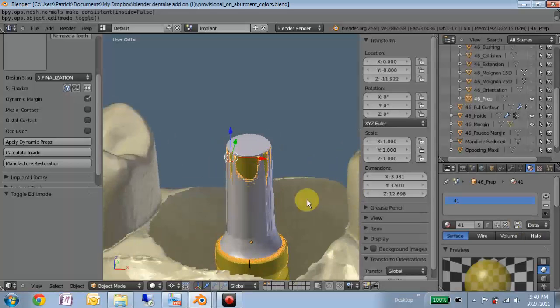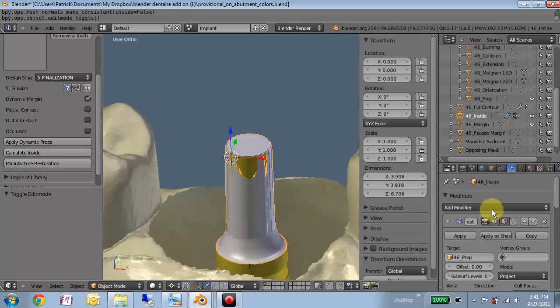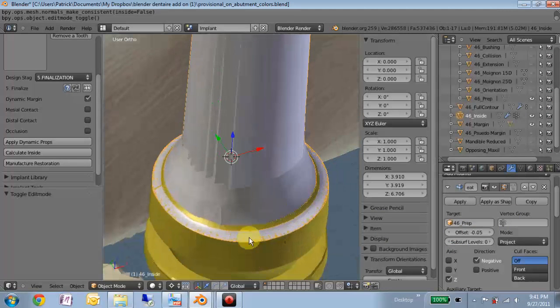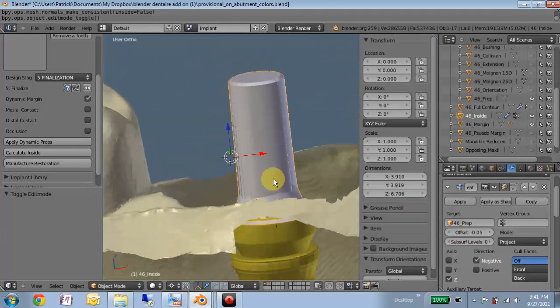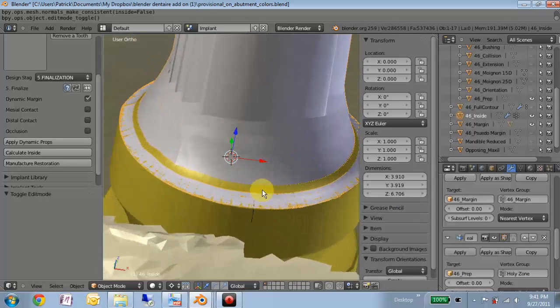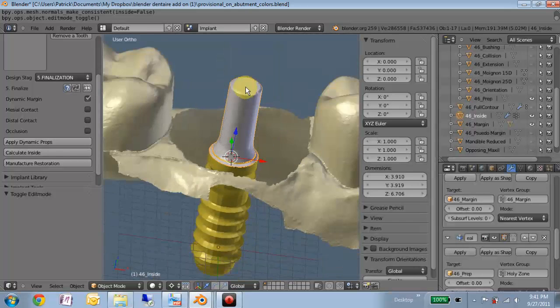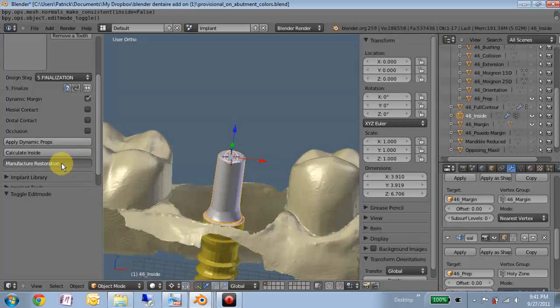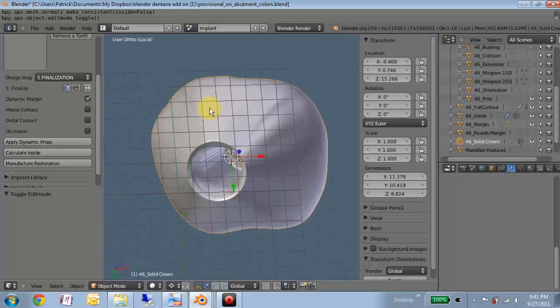seating down onto it. So if we go to the inside model, here we can kind of play around. I think this is what I did to fix it. Yeah, you can just kind of play around with these settings until you find, let me see, that's actually going to bind right here. So I haven't quite figured out an elegant way to make this fit perfectly, but just for the sake of moving on. Alright, there you have it.